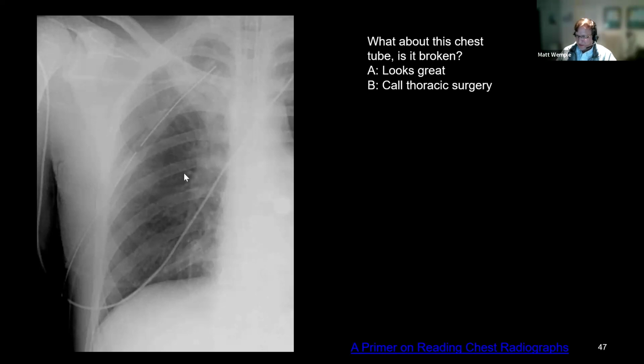So this one, this is a chest tube. This is probably a surgical chest tube. It's pretty wide here. You'll see these surgical chest tubes most of the time in trauma patients, and then you'll see more radio opaque tubes that curl up into what's called a pigtail. Sometimes you'll see those placed by IR or one of your pulmonary colleagues for effusions or some pneumothoraces.